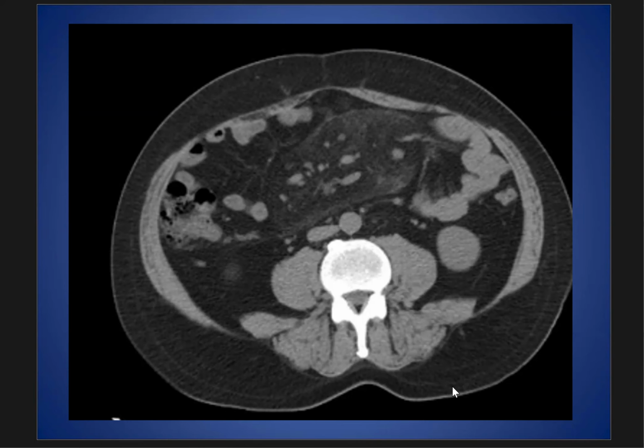And we see in this patient, presented with abdominal pain, as we see here, ovoid, well or sometimes maybe ill-defined increased attenuation of the mesenteric fat, with thickening of the mesenteric fat and also some nodules here.